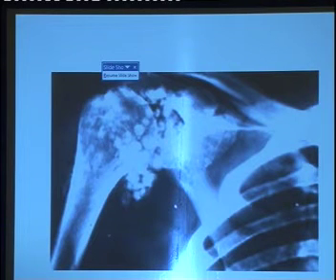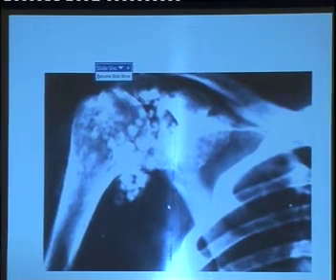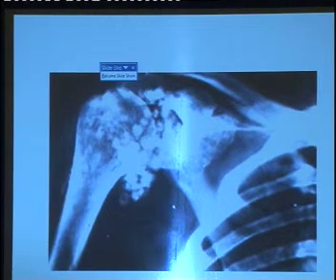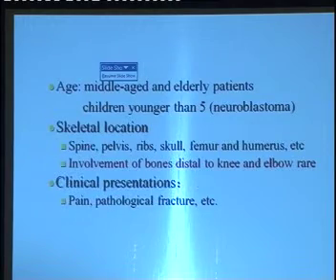Lesions are there, a huge tumor around it. It might almost look like either neuropathic joints or osteochondromatosis. Now, go through the metastatic lesions.